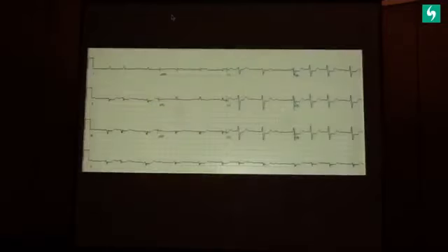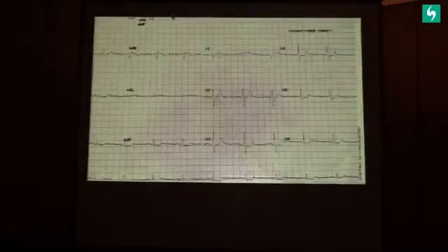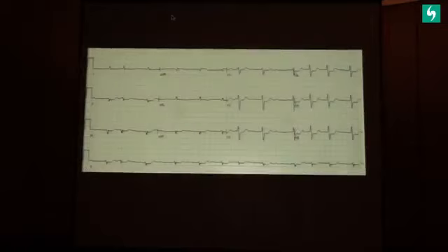Now this is also a very important ECG which I am going to show you. This is a patient who actually died. This is a patient who had post-op CABG, came in the night with this ECG. You would see there is atrial fibrillation, so the concentration went on atrial fibrillation, less concentration on these ST depressions and AVR. I keep coming to AVR because it's a very important lead. Now, you just look at this AVR. This ST is a little bit high. It's just 1 millimeter high.